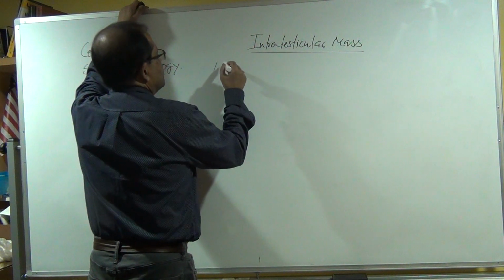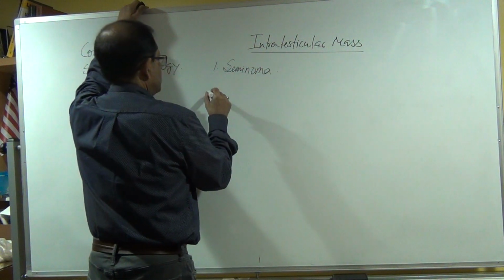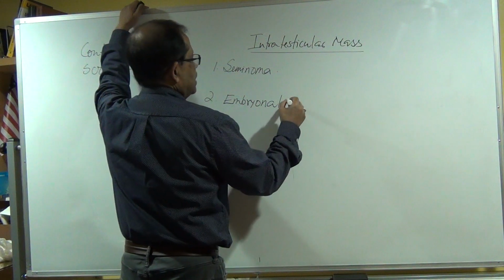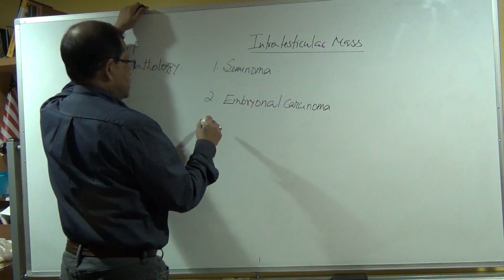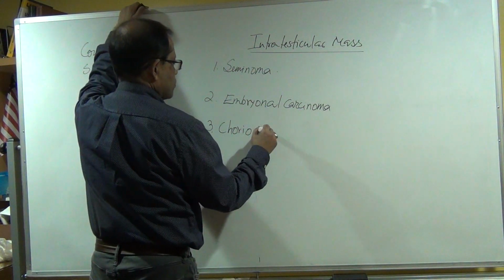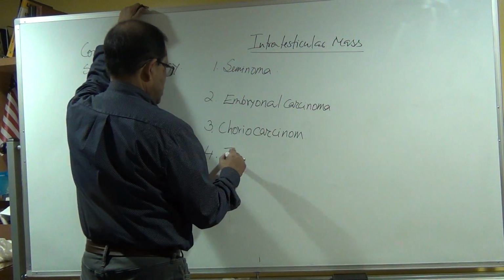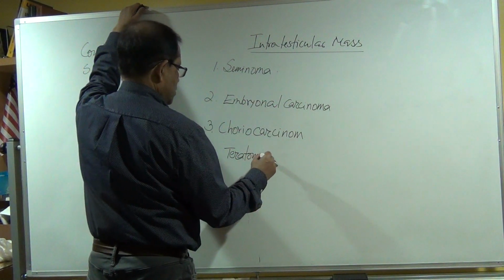You can see number 1, seminoma. Embryonal carcinoma, choriocarcinoma, teratoma.